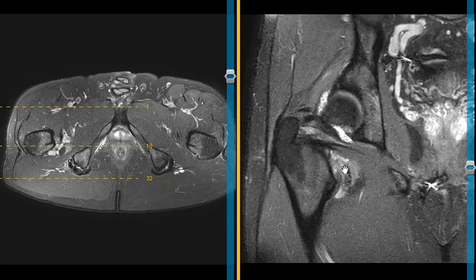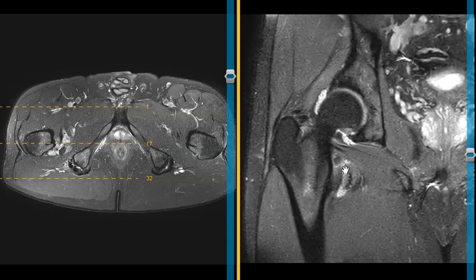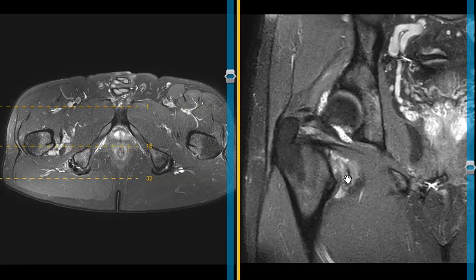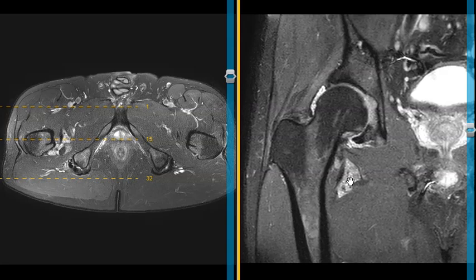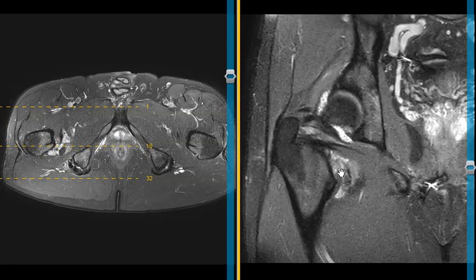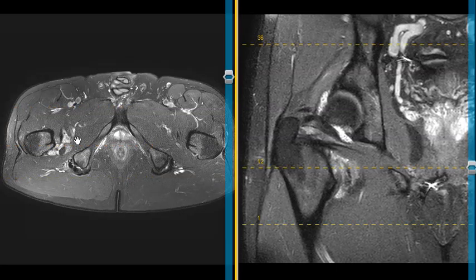So there's a potential space here called the lesser trochanteric bursa, and this patient has inflammation of that bursa, and the inflammation is bright with these little nodular areas of darkness throughout it. That means there's really prominent synovial inflammation, and also there are broad bands of this low globular signal that are probably areas of scar tissue within there. So prominent inflammation of that bursa.